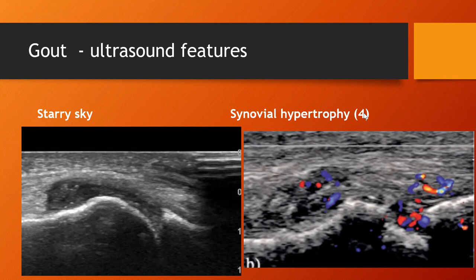Ultrasound, while it might not detect the difference between rheumatoid and gout, we can measure the size of the erosions and use a criteria that was developed for rheumatoid arthritis in gout. In rheumatoid arthritis, they said less than 2 millimetre sized erosions, we call that small. Moderate are 2 to 4 millimetre erosions, and large erosions are greater than 4 millimetres. That was a criteria developed by Wakefield, which is reference number 5. So we can use that for gout as well.